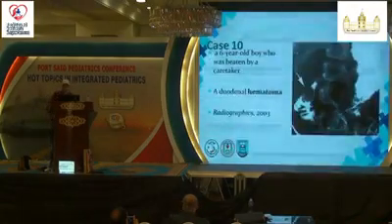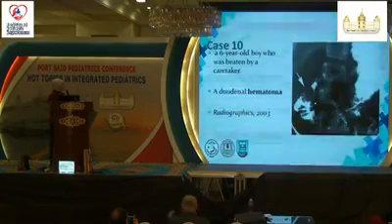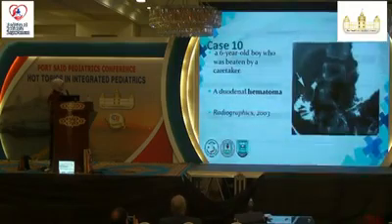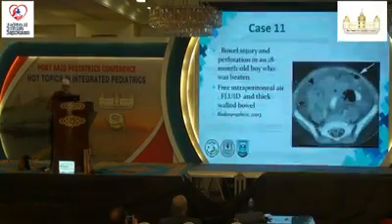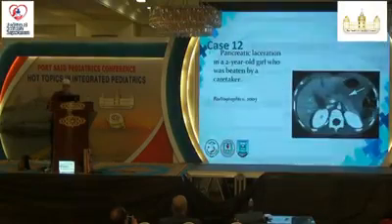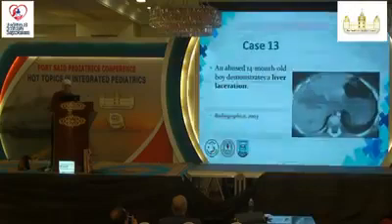So also visceral trauma. A 6-year-old boy who was beaten by a caretaker. Okay, this is a barium meal, and there is a filling defect here in the duodenum. It's also one of the signs of child abuse. This one here, perforation of the bowel. That one is laceration of the pancreas and laceration of the liver.